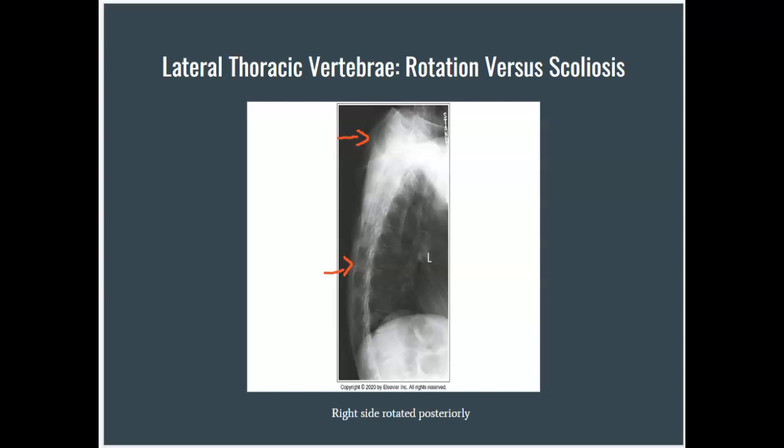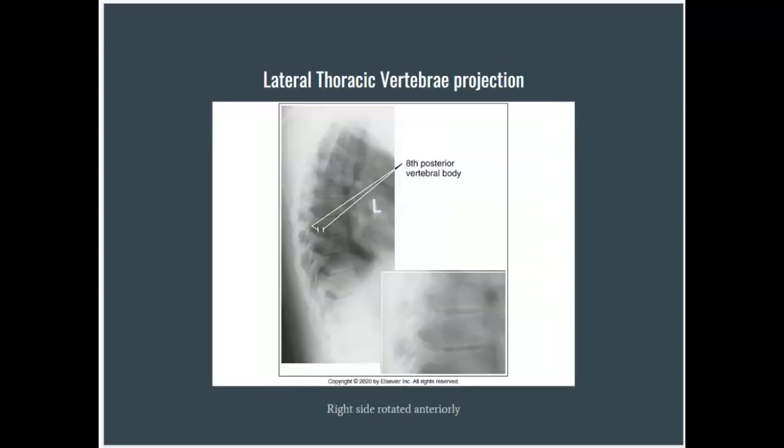When we move on to the next image here, you can see this is indicative of a patient slightly rotated anteriorly. You can see that there is slight rotation here.